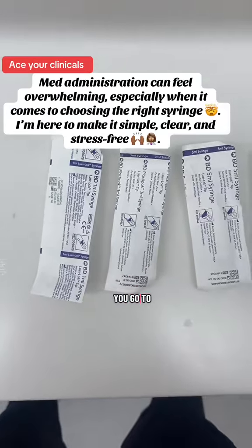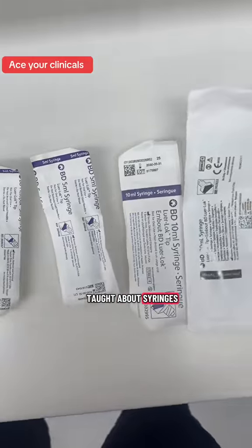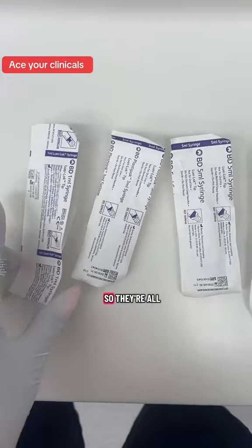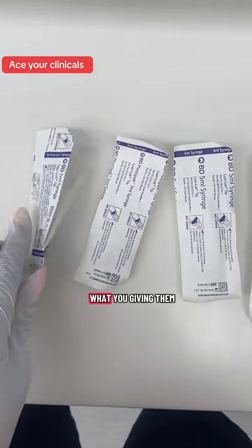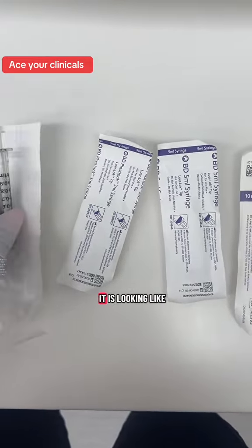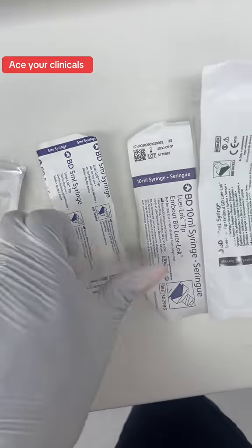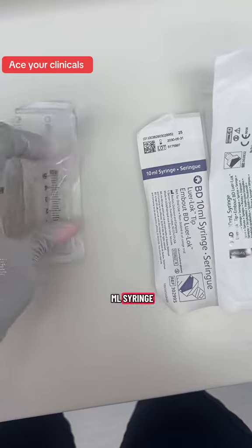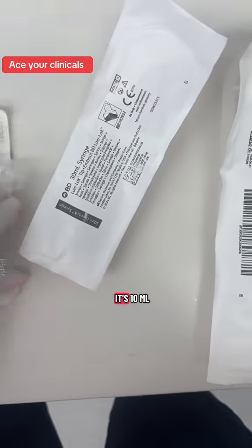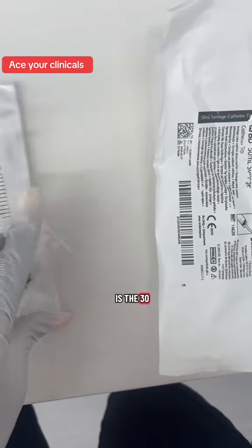Alright, so when you go to your clinicals, you will be taught about syringes because your patients will be getting all types of syringes. They're all sizes depending on what you're giving them. So this is the 1 ml syringe. This is what it looks like, and we have our 3 ml syringe, and then you have your 5 ml syringe. This is what it is, and then 10 ml syringe is 10 ml, right? And then you have this, which is the 30 ml syringe.